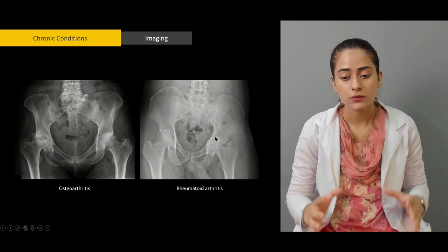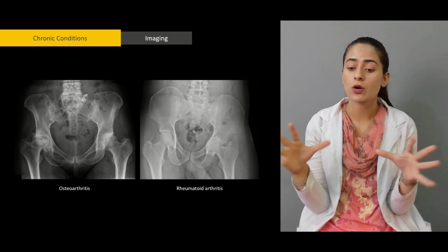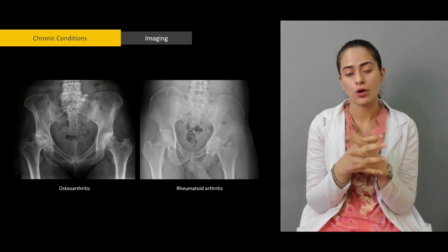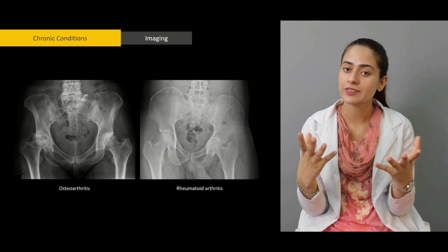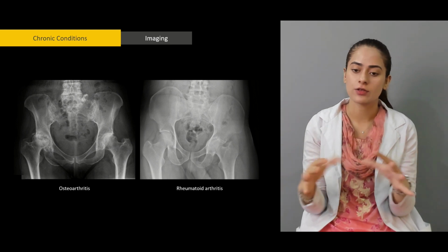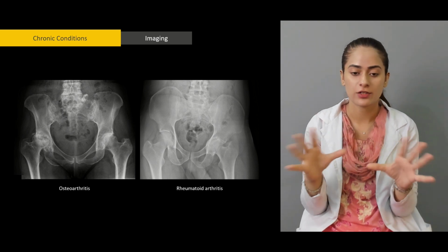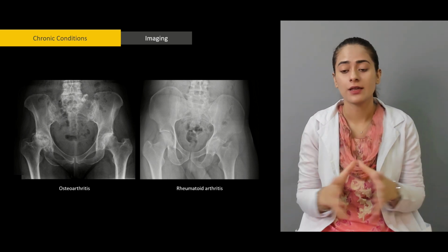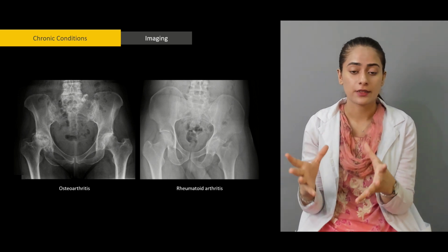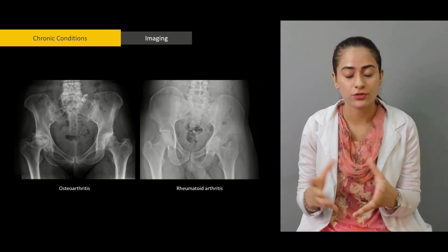So again, to differentiate between OA and RA, all of the signs will be almost the same. So how do you differentiate between OA and RA? Basically, you do blood tests. Radiology alone cannot diagnose everything. You can diagnose fractures and what type of fractures, and you can tell a lot of things, but these are facilitatory tests. All the radiographic imaging tests are actually facilitating your diagnosis.